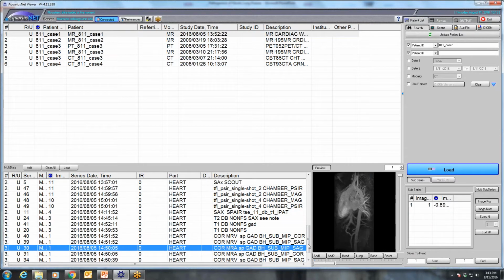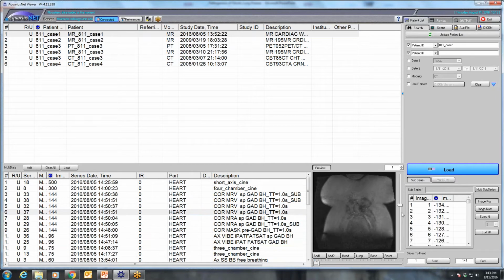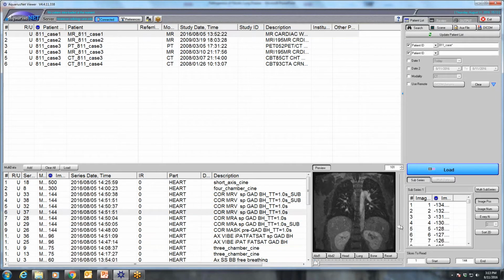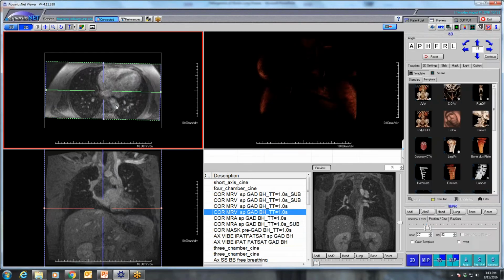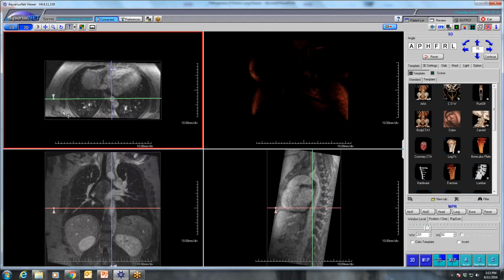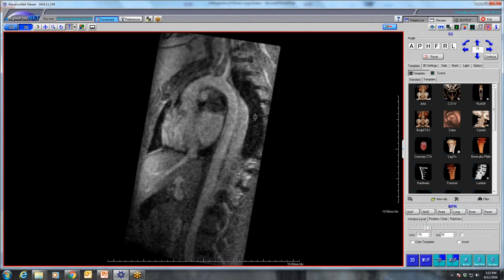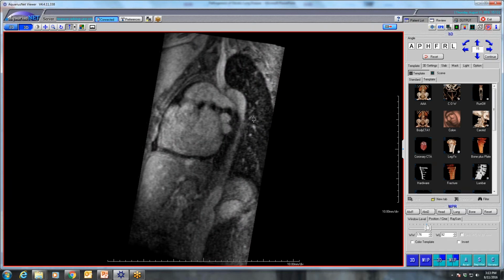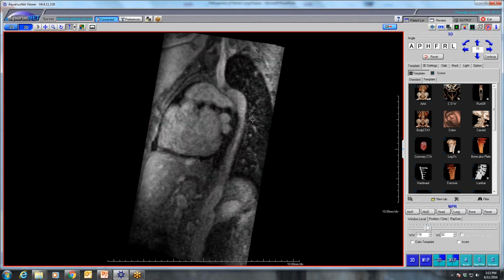This is an interesting case only because I had not seen this before, and if I see something that is fascinating to me, I'd like to show it. This is a person who came in with an unknown history. She was thought to have some sort of mediastinal cyst, but also this weird abnormal ultrasound, which showed what looked like two aortas, and she had a dilated sinus.